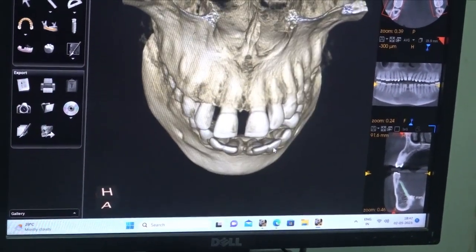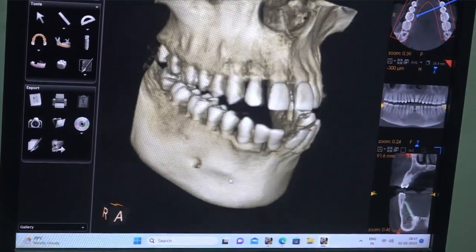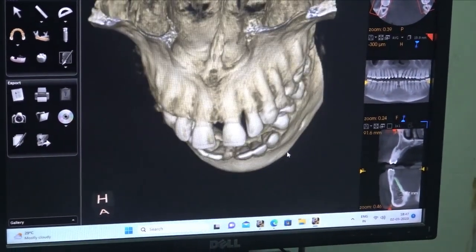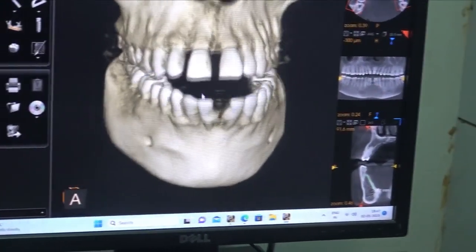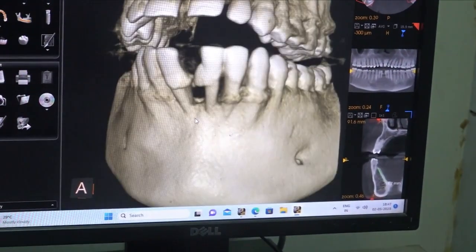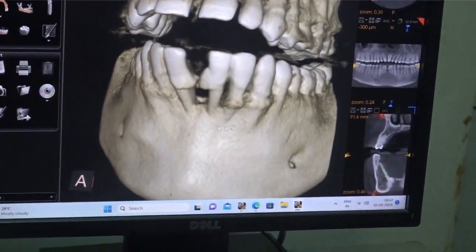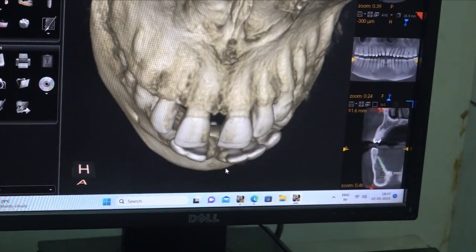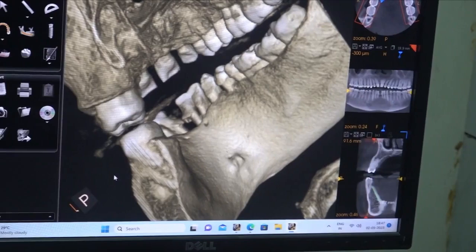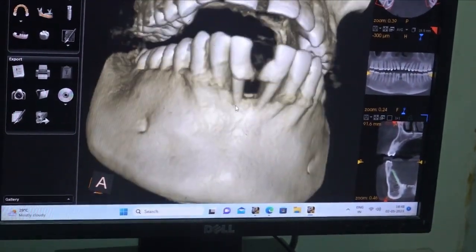So lateral to lateral has moved very much forward because bone loss is more there. Because the canine has got long root, it is sustaining, it is not coming outward, but however it is moving forward. Now the plan is to remove the 4 incisors. So we will plan how to place the implant. So first decision is which tooth you are going to remove. Lateral to lateral, canine no need to remove because it is in a reasonably good position. By doing gum treatment we can save the tooth. So only lateral to lateral we can remove and go for implants.